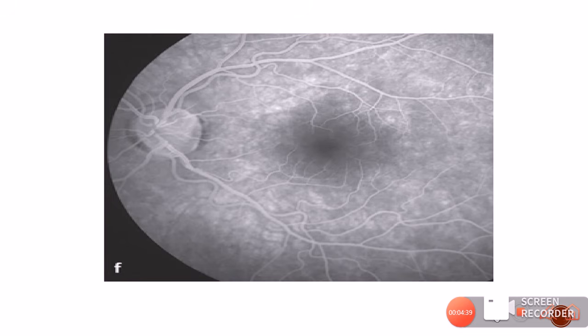Now this picture over here shows the late phase or the recirculation phase, and you can see that the choroidal fluorescence has now become patchy. You can see certain dark areas. That means that the choroidal phase is now going away, and even in the retina, you can see the vessels are not as bright as they were in the venous phase. Now what happens normally in the late staging or the recirculation phase, which you should remember, is actually the staining of the disc. So a normal disc will stain in the late phase or in the recirculation phase.